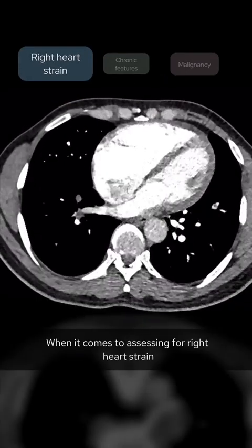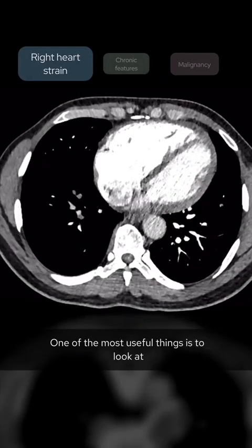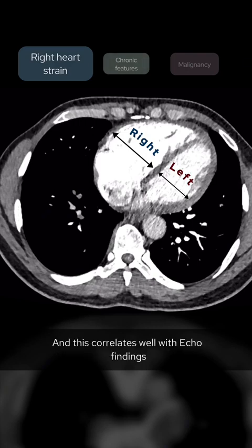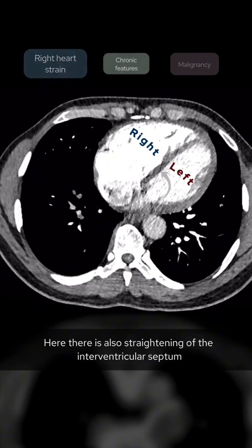When it comes to assessing for right heart strain, one of the most useful things is to look at the ratio of the diameter of the right ventricle versus the left ventricle. If the right ventricle is larger than the left, we can say there is right heart strain, and this correlates well with echo findings as well as 30-day mortality risk from PE. Here there is also straightening of the interventricular septum.